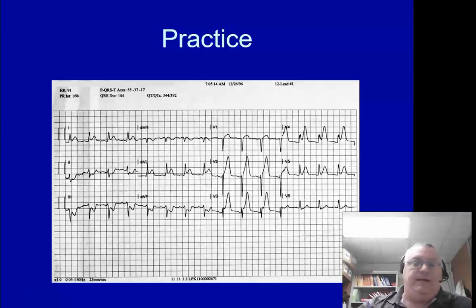All right. Now, if I keep practicing here, oh wow, yeah, look at that. And by the way, notice depression. Ooh, elevation there, right? Elevation, elevation, oh, depression. But if we do the teeter-totter, the different parts of the heart that it's looking at, I'm going to see those changes. Oh, elevation, elevation.